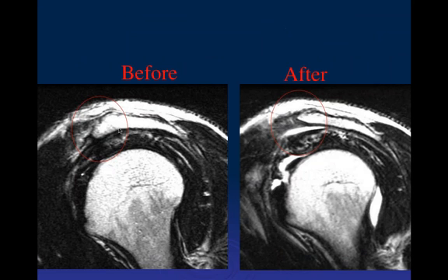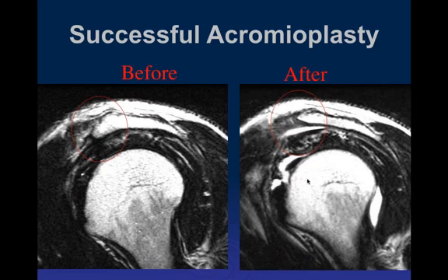And here's a case of a patient with symptoms. Here is before. This is the anterior osteophyte. This is after, where it looks like they just removed the osteophyte itself. And it looks like it relieved the impingement process in this particular case. Okay. Deshali, what do you think of this case?